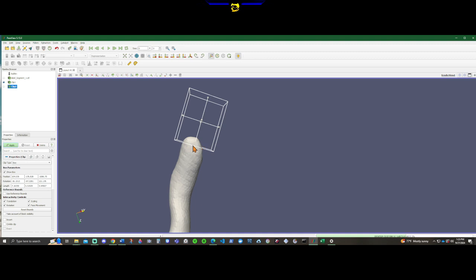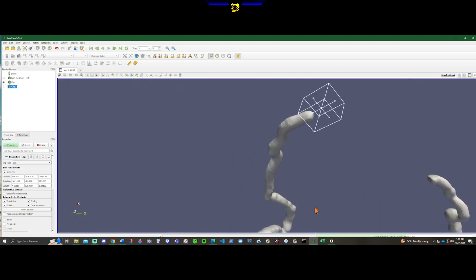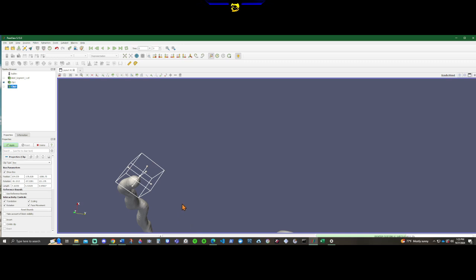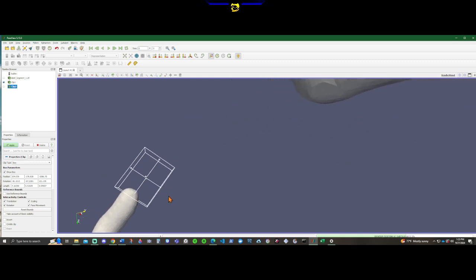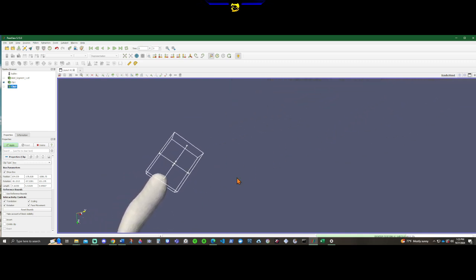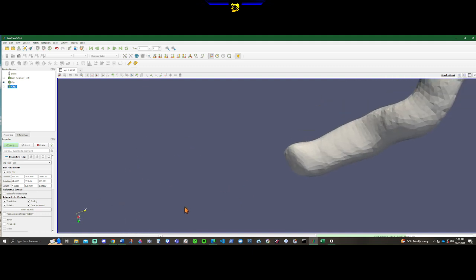It's off to a slight angle, and we're just going to fix that real quick. So again, you can just drag one side of it and use that to make sure it fits whatever you want it to fit. So for me, I will drag this side here, and let's see if I can get this. Maybe another side of it like that. Yeah, this looks good to me.